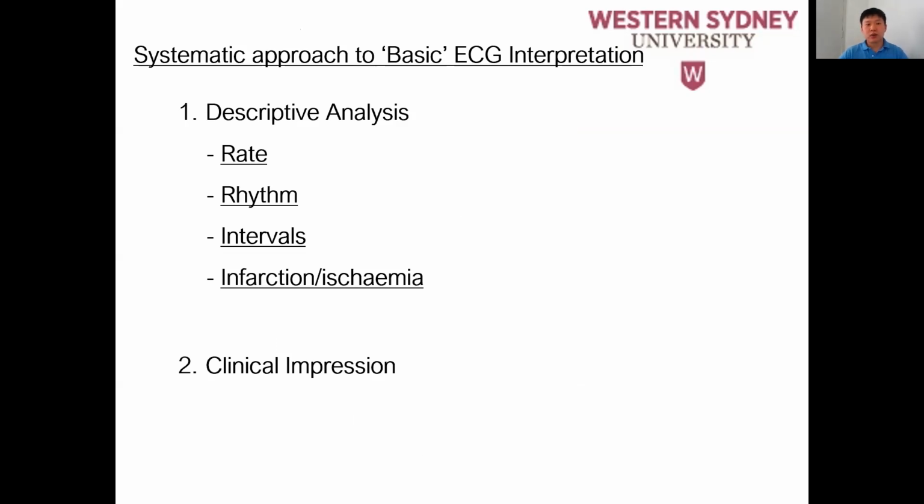Now I will go through a systematic approach to basic ECG interpretation. Just to note, this is a basic ECG interpretation. For more advanced interpretations, there are a few more steps that we use. I won't be going into that much detail in this tutorial.